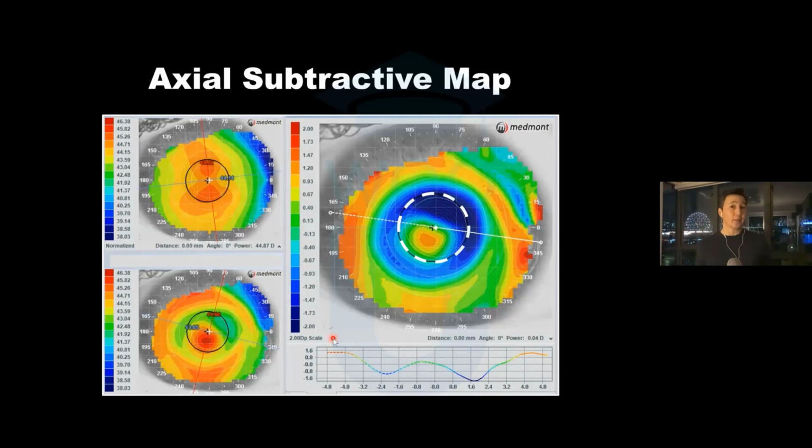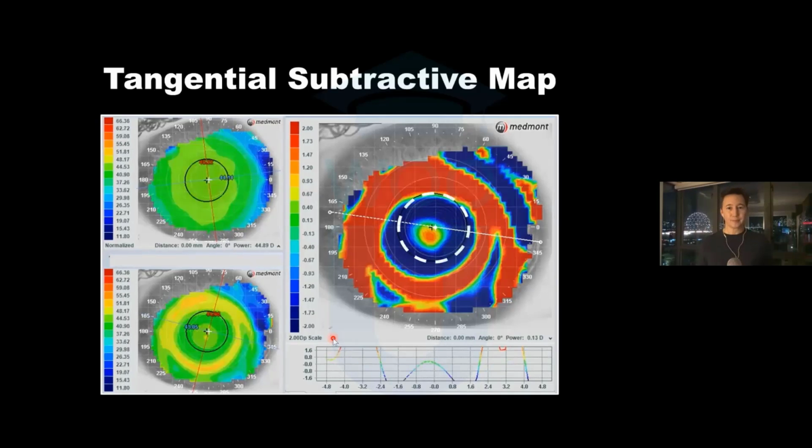If it's a higher myope, like a -8 Ortho-K effect, then I might adjust the scale up to match the treatment we're creating. So that can be a helpful hint when you're assessing these post-treatment outcomes. Set the scale specific for the refractive change that you're using.